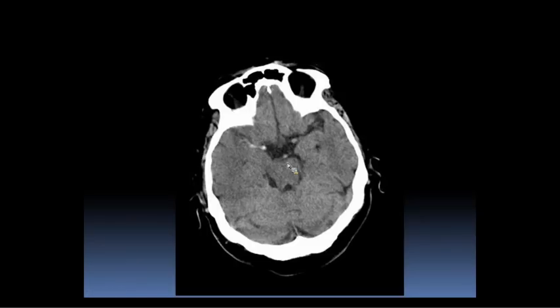And what we're looking at here is the clot, the fresh clot, and you're actually directly visualizing it. So this can actually be the earliest sign, because before you have any frank changes, you have the thrombosis, right? You have the clot. So this can be the earliest sign before you see anything else.